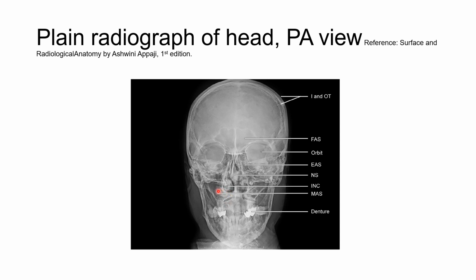Now you can also see something white colored, much whiter than even the bone. I guess it is the false tooth that they put in, or the denture. We call it the denture.